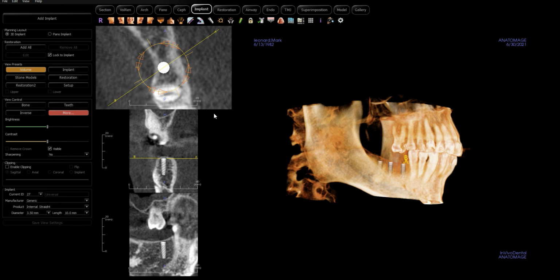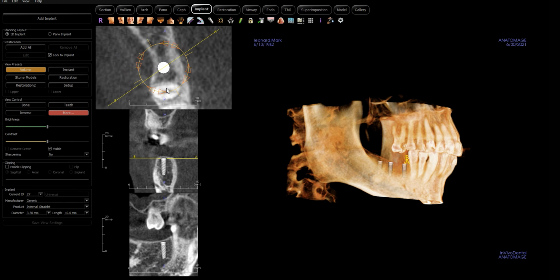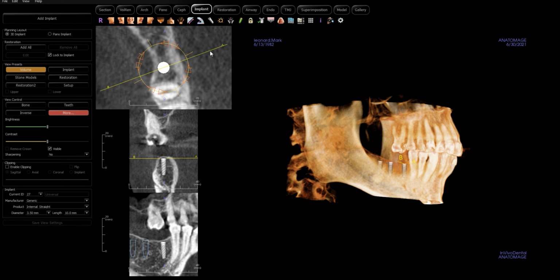This patient will not be receiving a surgical guide for a variety of reasons. I think this is a wonderful case for you to plan a very well executed freehanding approach. What we'll do is we'll put the implants approximately where we think they'll be, but we're not going to go to the level of execution that we would if we were going to do a surgical guide. So if you decide to do a surgical guide, we can do that. We would just need a scan after you are finished with the Invisalign and the lower arch and finished with the PMMAs, because the surgical guide needs to be made on the teeth as they are. Otherwise, the guide wouldn't fit.